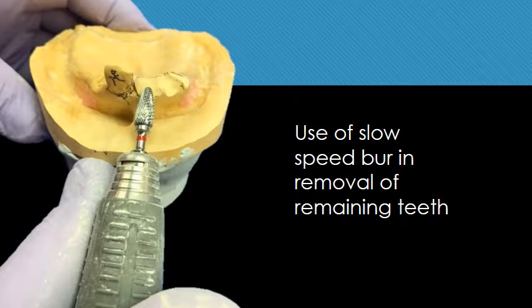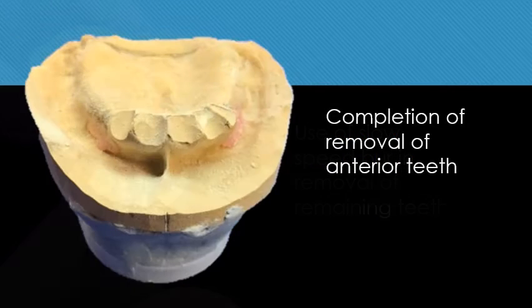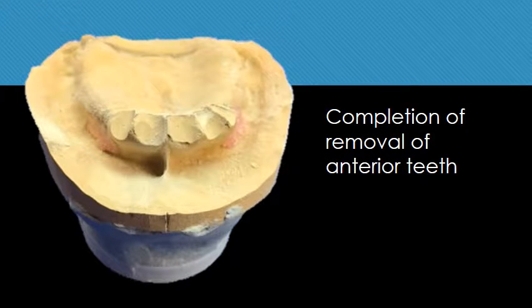As we approach the finishing of the removal of the anterior teeth, we followed the outlines previously placed on there so that we now can have a replication of the interseptal bone, which will remain and have to be modified along with the undercut. The overextension of the anterior land area is extraneous, and it should be removed so that it can be fit into a processing flask.